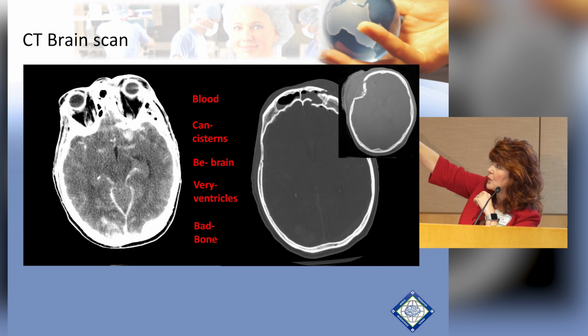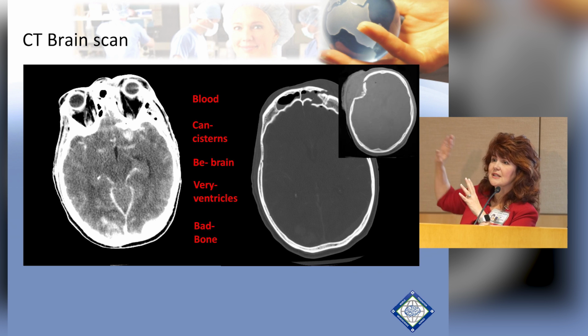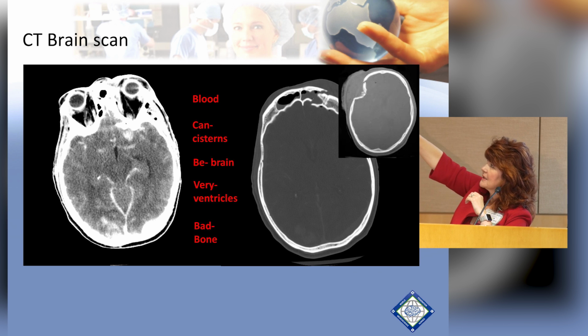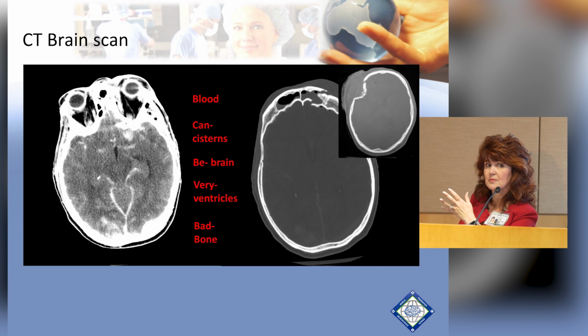And so you can see the bone window. Do you guys see the fracture? And there's like this obvious sign that you have this big lump. Do you guys see it? At the very top on the left, which would be considered your left, it looks like right, but it's left. And there's a fracture, and there's a ton of soft tissue swelling around it. And so that's how you know. This is another example of a fracture with soft tissue swelling. So look at the soft tissue as well. So that's an obvious depressed skull fracture.